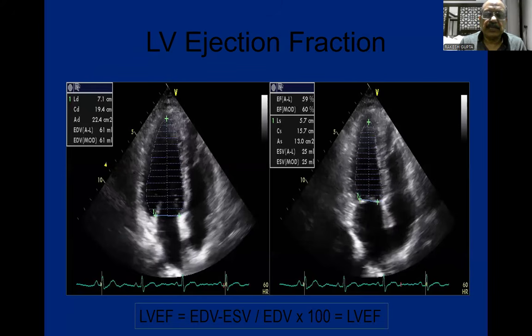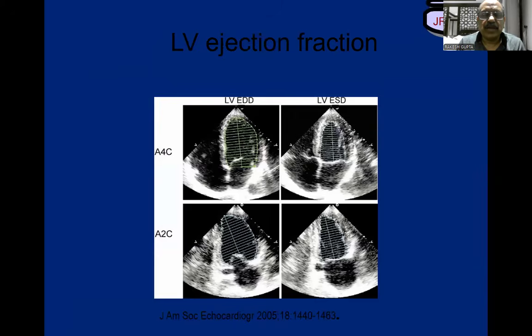Third important part is calculation of ejection fraction. Well, we have to calculate the ejection fraction in two views. One is a four-chamber view.